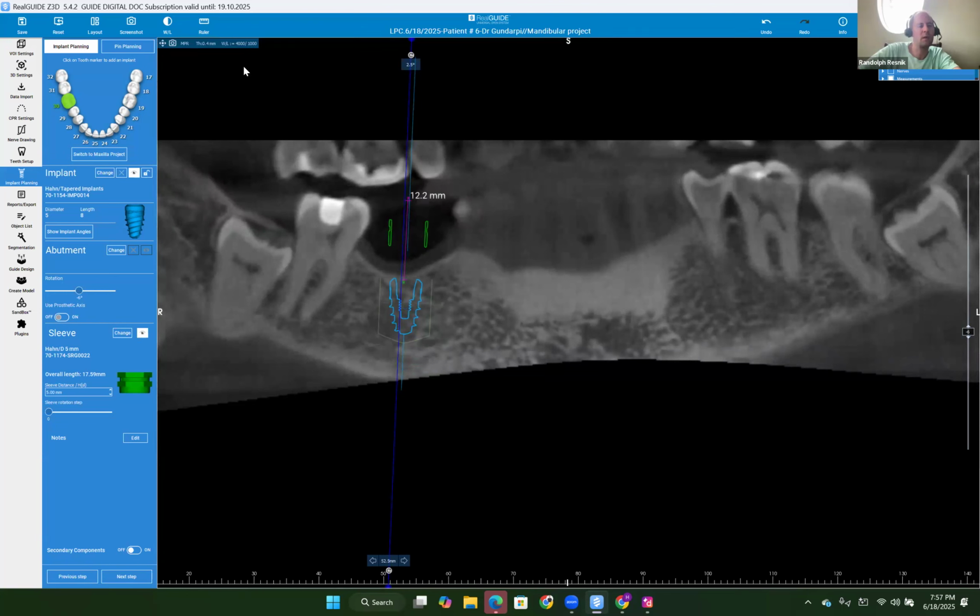I think it was 14 and a half. Yes, sir. So with a 5 by 8, that's a shorter implant there at the molar site, especially when we have a poor crown to implant ratio. But we are also going to have a pretty significant mesial and distal cantilever here. If it's 14 millimeters and we have 5 millimeters, we're going to have almost 5 millimeters of cantilever on both sides there.